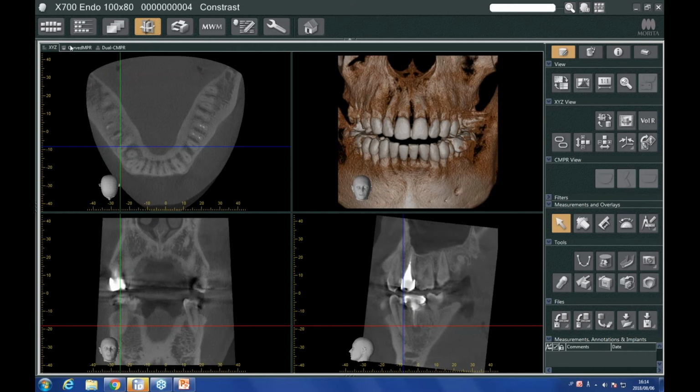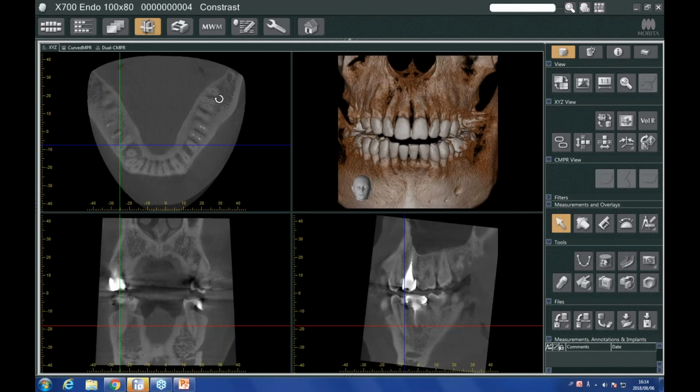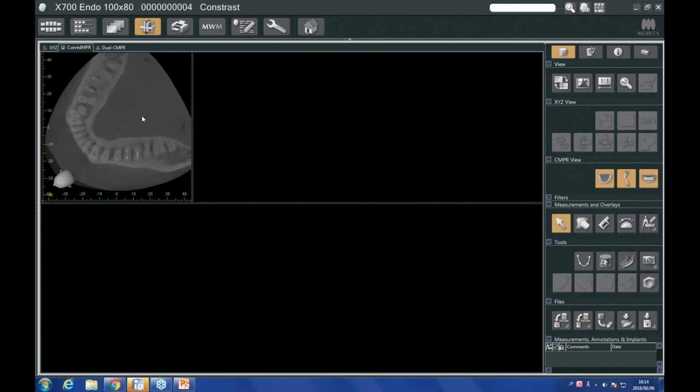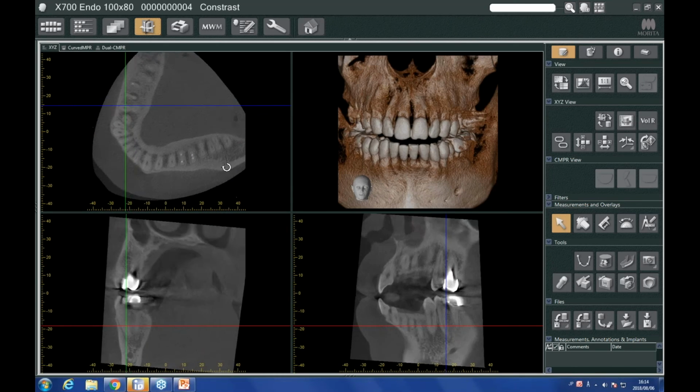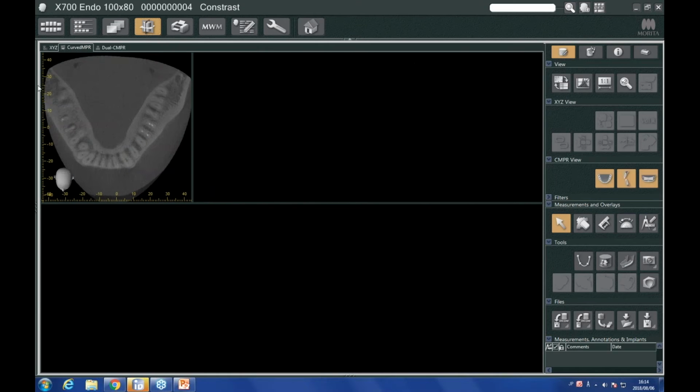So if I click on this tool or this tab here, what you're going to see is whatever image I have here in this window is going to show up here. Just to make it very obvious, if I rotate it like this, it will again be rotated here as well. So I'm going to reorient very quickly and then go back to my curved MPR view. And I want to basically mark a spline, a curve that matches my dental arch. Now this arch is going to be different patient to patient, and also is going to be different depending on the orientation of your volume.